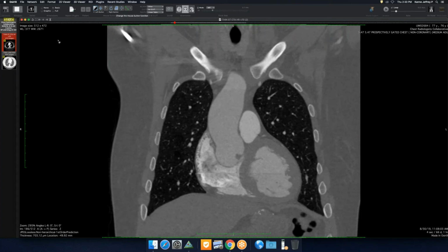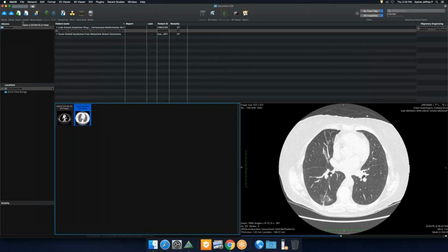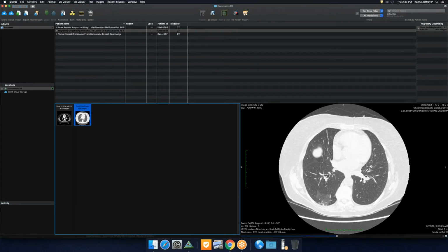I don't think I put it in all 3 planes, but I'll get these cleaned up and then send you that. But it is a nice case of organizing pneumonia, just pretty atolls, but they moved around. That was the finding.